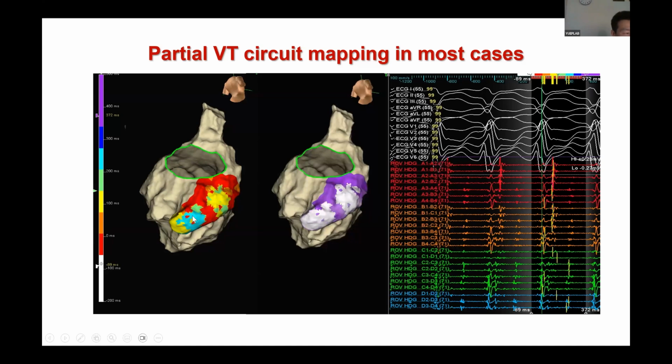How do we interpret this trace, this activation? It looks like chaos. Probably there is a breakout here and it moves out, surrounding the area will be the outer loop and goes to this area. Why? Because you have too many components that you need to annotate, because you just recorded the signals within a very small area. So it's just like a localized reentrant.